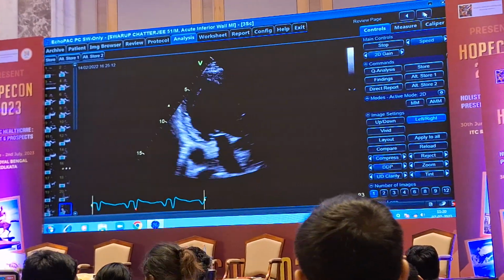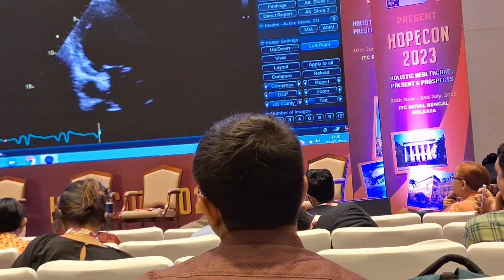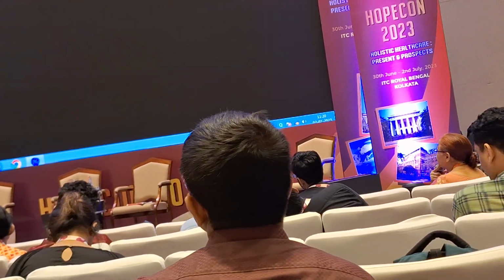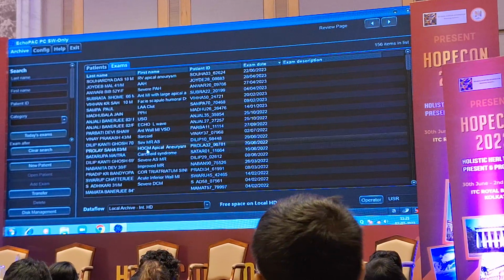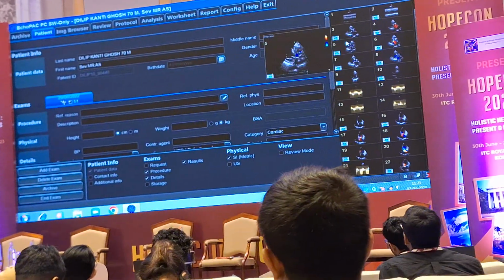So this way, I think you got your case. Also another case that is very important. How to find out the particular problem, in this case I'll show you. This is a very interesting case.